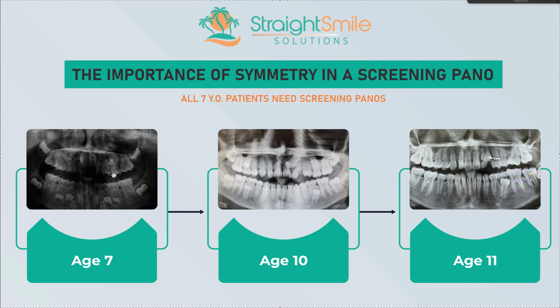Now, kind of hard to see on this side. There's just a big blobby mess. You can't even differentiate the 2 premolars from each other. The canine is up there. It doesn't have enough eruption lane. This is just a big mess.